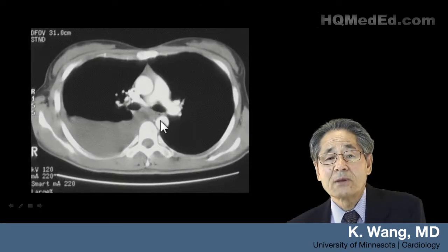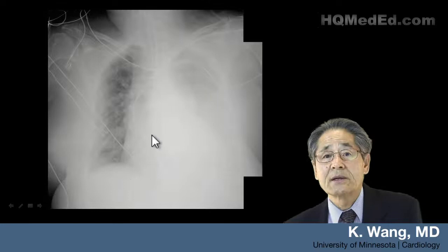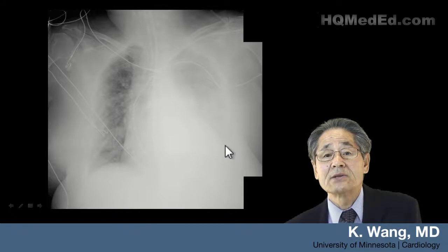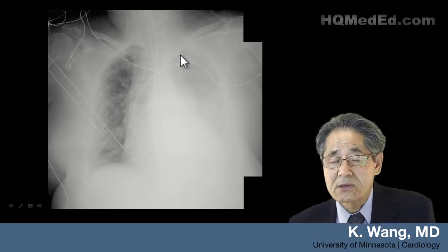Well, this is from another patient with a CT scan of the chest who had unilateral pleural effusion. If this patient had a supine X-ray, where X-ray beam goes from here to here, no wonder then one side of the lung will be almost opacified or densely white like this, making us think of atelectasis.